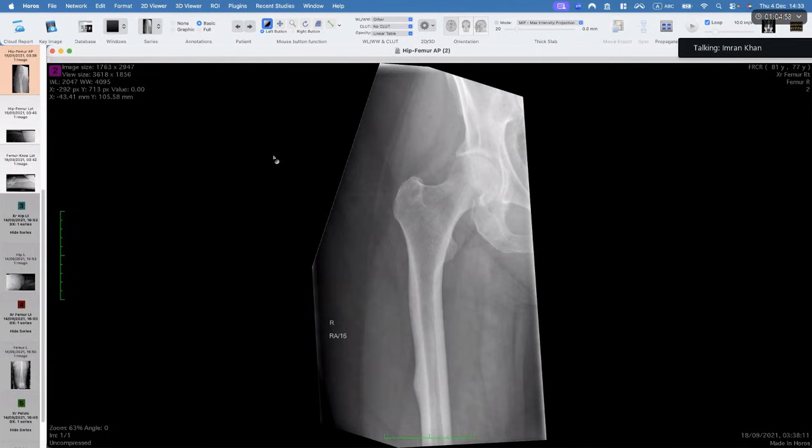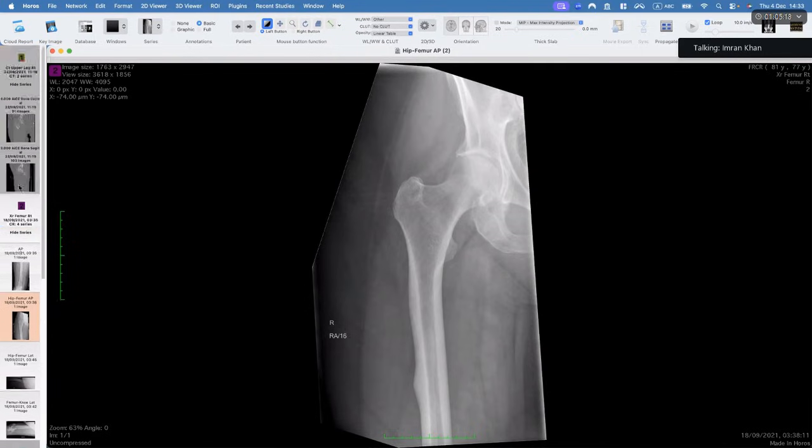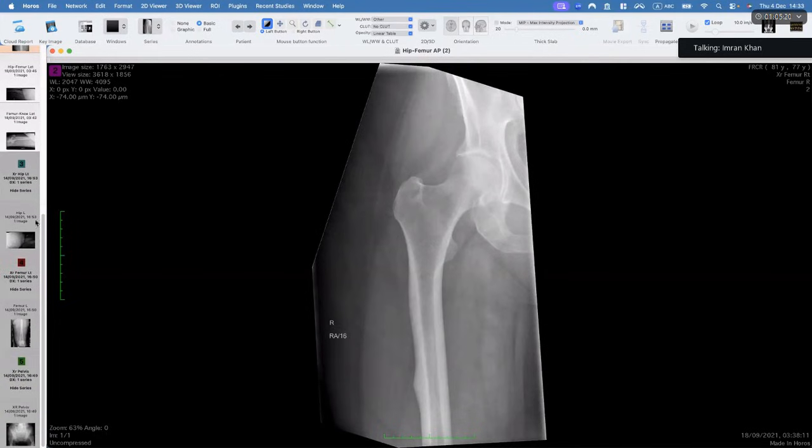This is actually an Aunt Minnie of a case. This is a type of insufficiency fracture, but this is the type of insufficiency fracture where the bone density is normal. And I tried to give you a hint. I said a 77-year-old female, a female. This is a bisphosphonate fracture, okay? And the imaging appearances are fairly typical, okay?